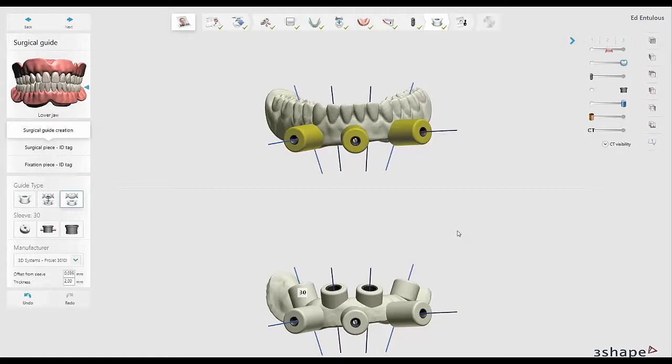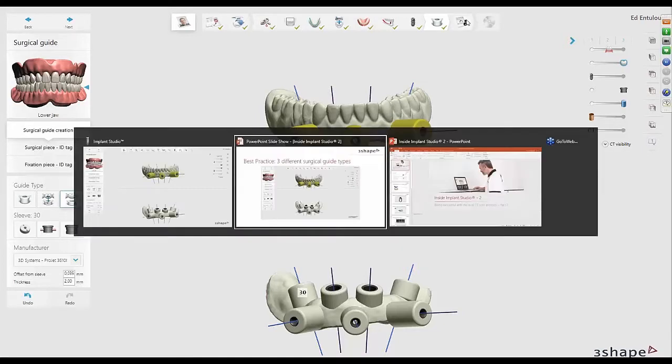There's more to come in the 2016 version, including the ability to export the gingiva with the implant position for further use in dental systems, the dental lab. We're going to talk about this more in 2 weeks' time. I think that's it for today, on the actual demonstration.